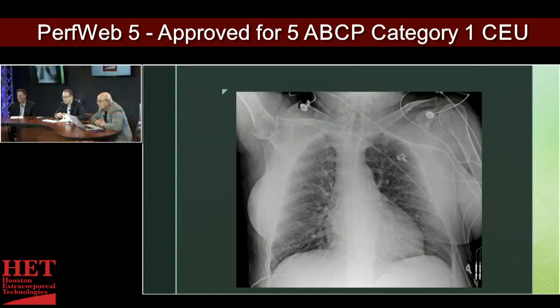I've been fooled. The patient was laying on a cap to a syringe, or they had something radio opaque sitting behind the patient, a foreign body of some sort, and it looks like they've swallowed something, or they've been shot and we haven't found the entry wound in a trauma situation. You know, bullet entry can be easily missed, but that's not what this is in this case.